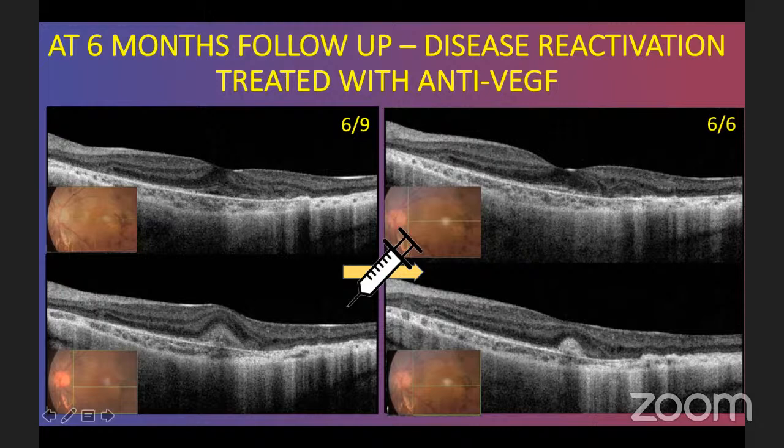And the second thing, if you see in the OCT, most of the time the CNVM is very irregular and it suddenly lifts up. But with the vitelliform deposits, there won't be a sudden elevation. It will be a gradual elevation and depression, like you see with CSR fluid. So that also helps you differentiate sometimes whether it's a vitelliform deposit or a CNVM. And yes, most of the cases are subfoveal and classical CNVM, type 2.